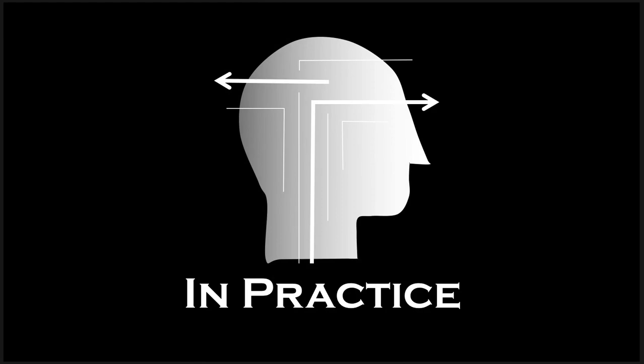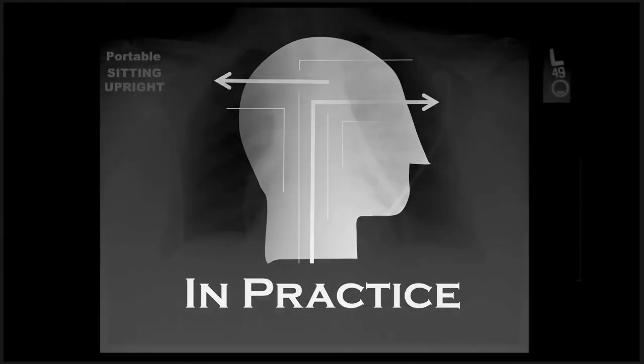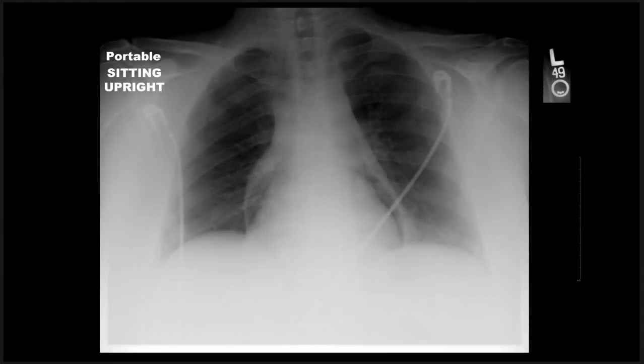Alright, another case here, slightly different this time. You can notice some abnormal gas around the heart, here and here. I want to point out to you that the air does not extend above the great vessels, here.